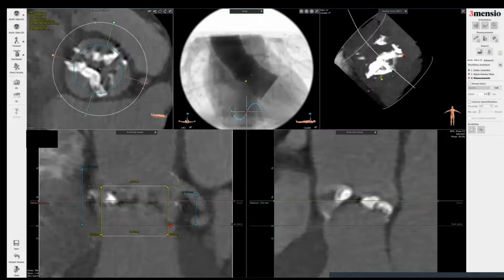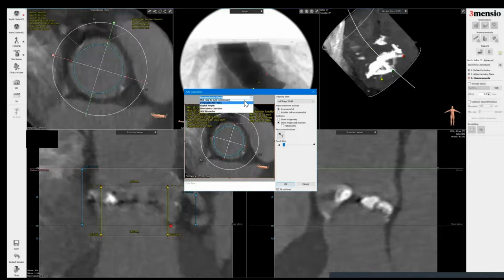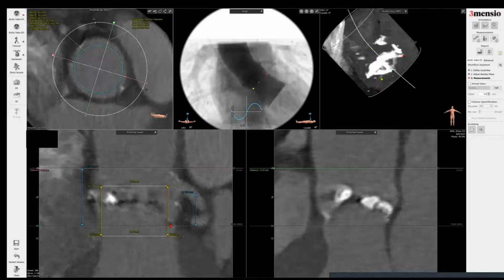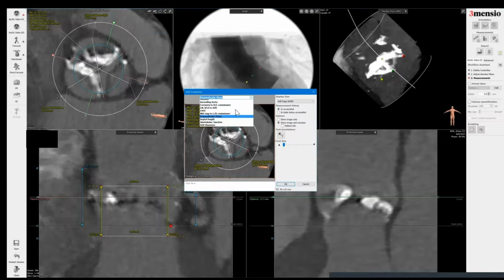So once you're done with the 10mm cut, I go back to the STJ. You can see how that fits. Sometimes if the STJ is small and narrow and you have a valve dimension that's bigger, you might risk dissection, aortic dissections. You want to see how that fits here. So I'm going to say this is a sinotubular junction. I go back here to save as sinuses of Valsalva.